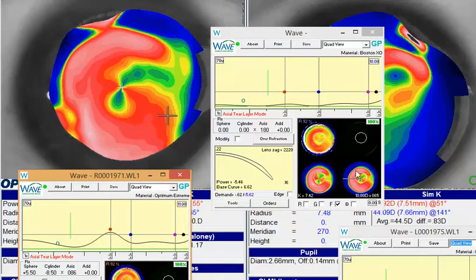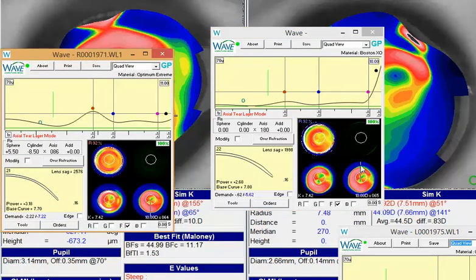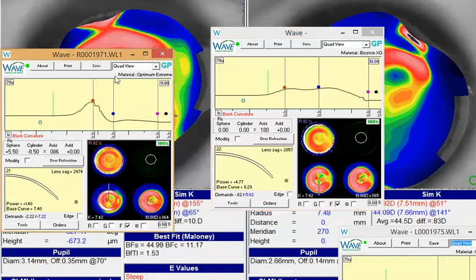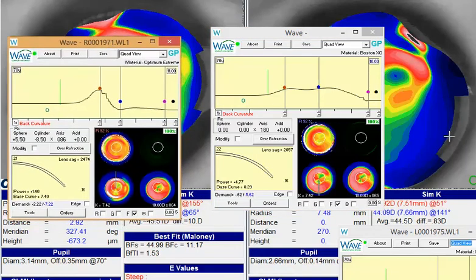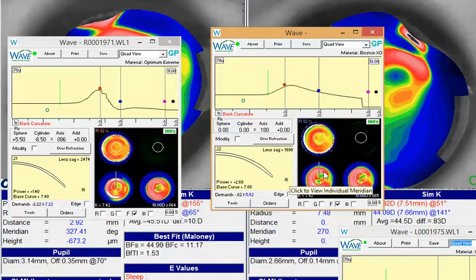And then you see when I design the lens, now you have a lens that mirrors that green corneal line very closely. If you go all the quadrants around here, and if you look at the back surface of this design, compare it to your original design, you'll see there's a little more harshness in the curves on that back surface. If you can get that to come up here. Whereas you see the newer design is a little bit more contoured in through here, so it gives you a little bit nicer flow across that back surface.